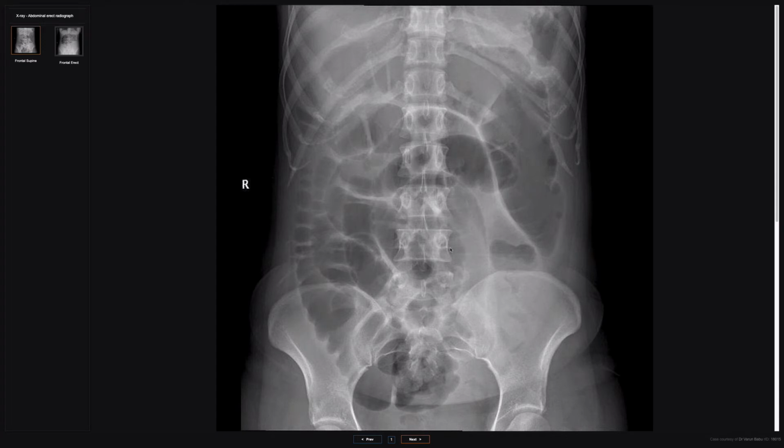So large bowel obstruction sometimes is difficult to appreciate as easily as small bowel obstruction, because often large bowel and small bowel obstruction occur concurrently, and so there's a lot going on on the abdominal radiograph. There's dilated small bowel and large bowel, and that makes the picture confusing. But here I want you to concentrate on this bit of bowel that runs around the edge on this right side, and then we go up to the top, and there's another loop here. And so this is the ascending, transverse and descending colon, which are distended.